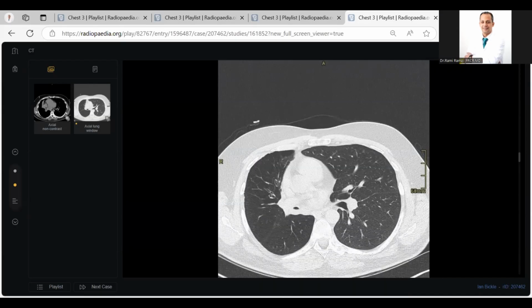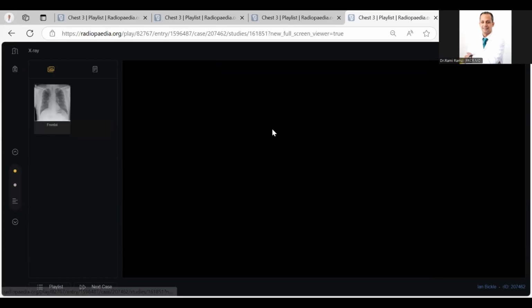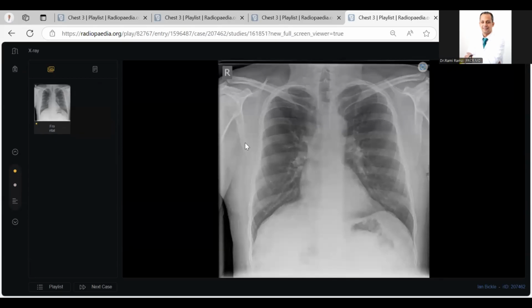Dr. Miga, who is the first candidate? Yeah, could you please show the X-ray of this case first, please? Yeah, okay. Thank you. What do you see? Yeah, there is hyperlucency here, hyperlucency and some reticulation. To be honest, there is mild volume loss here, because the right side of the heart is larger than normal. In the usual normal X-ray we just see some strip.